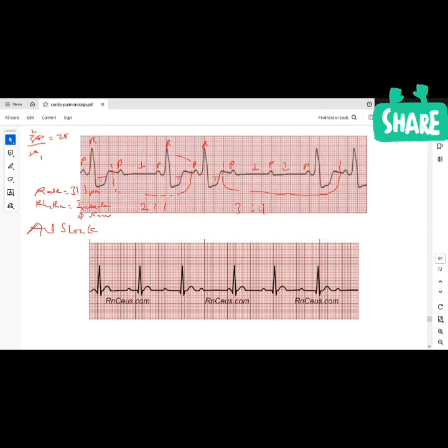Yeah, so the AV node is blocking some of the action potential from getting to the ventricles. So this is a much more severe block than the previous one, where we just have prolongation but no complete block yet. But here now we're seeing some intermittent complete blocks. So this is a second degree block. Clear? So far so good? Yeah, the first one was just a long PR interval, right? Yes. First, okay. All right.